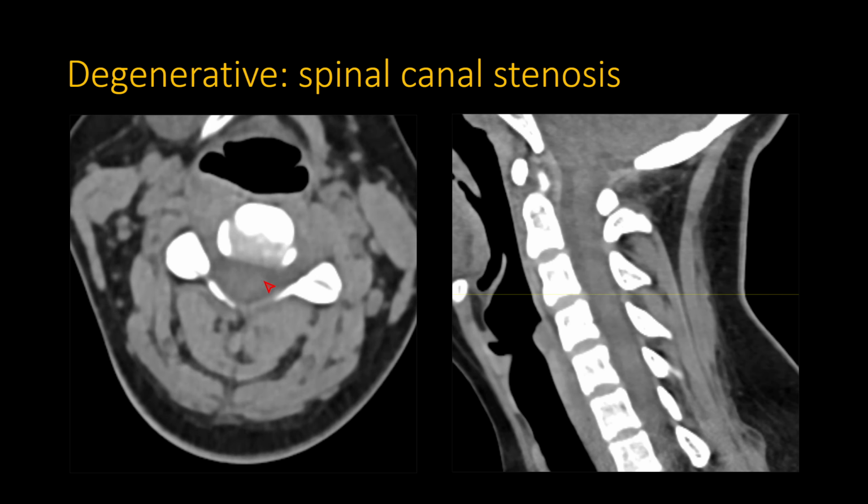Sort of what I use for spinal canal stenosis, especially if I have a good quality image like this. Here you can see, you can tell the CSF separately from the cord. See, the cord here is this darker or brighter material versus CSF, which is pretty much darker. And then you can even tell the discs are even brighter than both of them. So here you can see in this level, there's absolutely no CSF obliteration, so there's no stenosis. If there's just a little bit of CSF obliteration, but there's still CSF on either side of the cord, I typically call that mild, even if the CSF anteroposteriorly is obliterated, but there's still a good amount of CSF on either side, I call that mild stenosis.